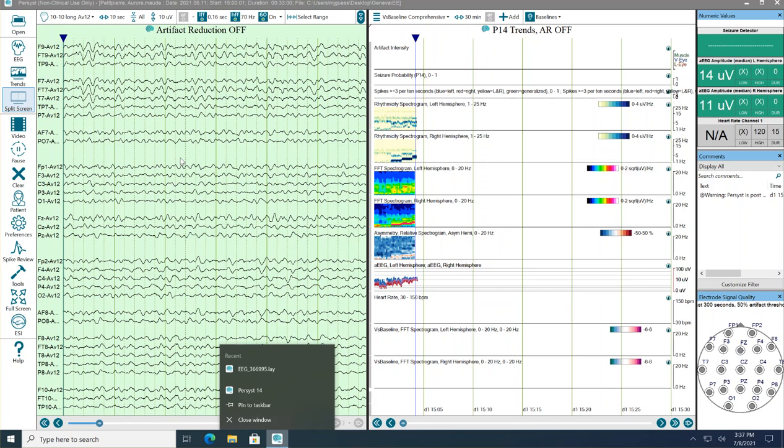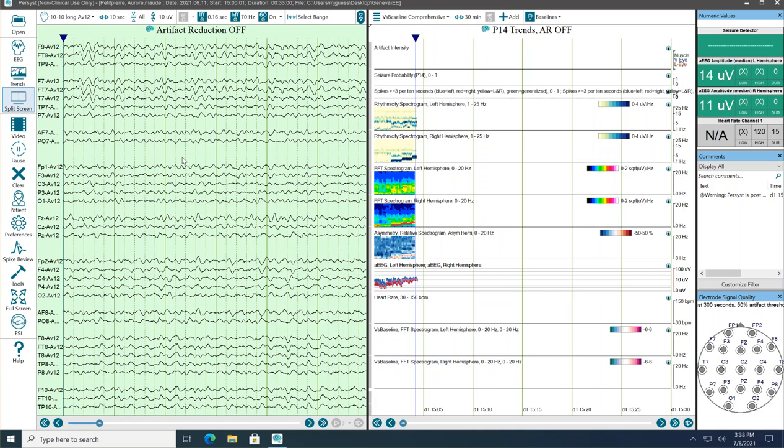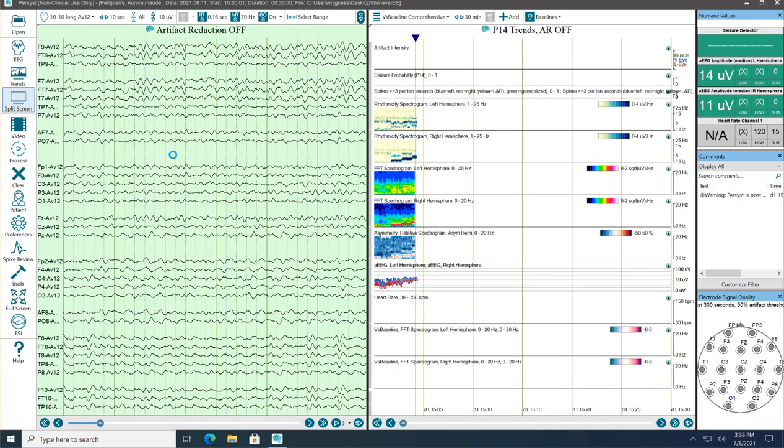And we'll get into some of the montage items that will help you as you're building montages if you want to add additional ones. Again, with that being said, I'll go ahead and populate some of the rest of the 10-10 positions here, the frontal, central, parietal positions. That will flesh that out. But this configuration will certainly work to get started.